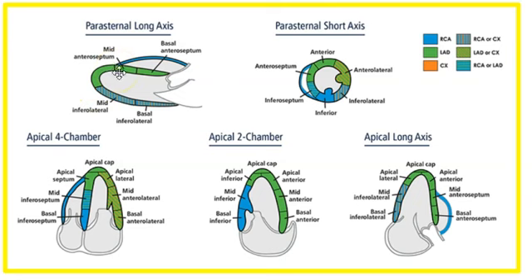We're going to talk a little bit more about that as we go. And you can see those are the coronary territories that are associated with each segment over here. So in the parasternal long axis view, that's what we're seeing as far as coronary artery supply and what supplies that particular area of the heart.